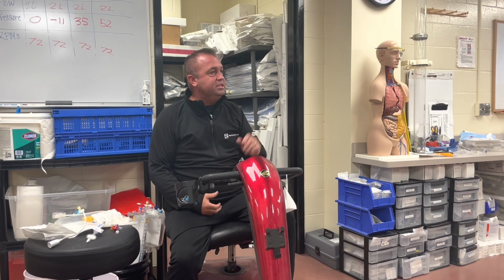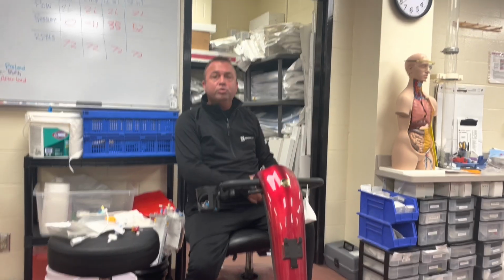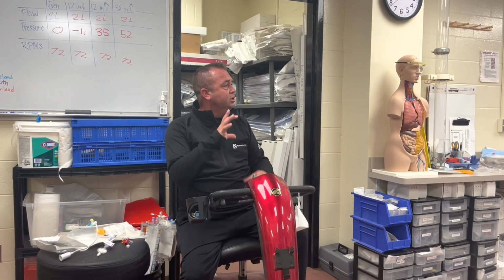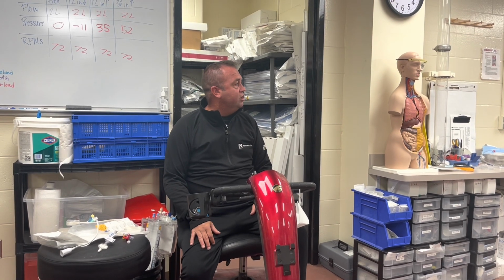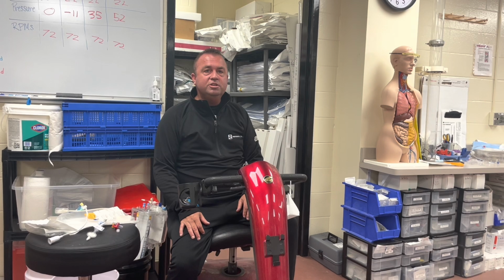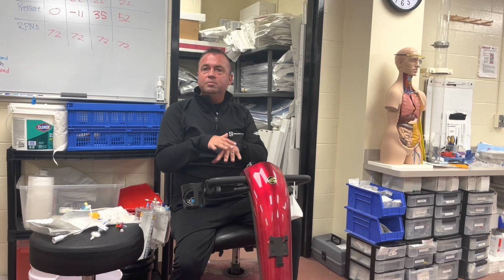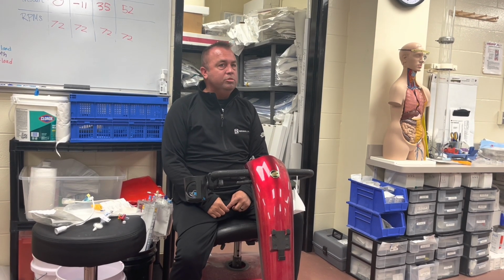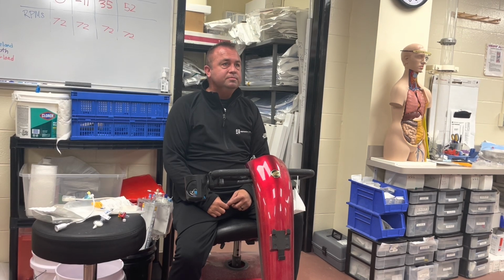That makes sense? Everybody get to see that? We can hook these up to any pressure in our patient. We can also hook that up to anywhere in our circuit and measure blood pressure off of our circuit. What do we use off of our circuit to measure pressure? A pressure dome, right? It gives us that membrane to measure pressure across. So we use a pressure dome on our bypass machine. Any questions? All right.